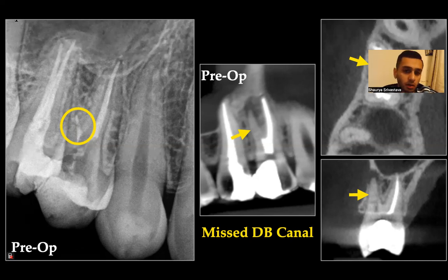First things first, get inside again, remove the existing filling, look for that 3rd canal, obturate, and the patient should be absolutely fine. So the prevalence again, your upper molars and lower molars, they're quite notorious to have extra canals. They can have bifurcations, trifurcations. In this case, we have 3 roots. Very rare to have that in an upper premolar, but it's not that we don't know of them. Okay, and there's no indication here that would tell me that there was a 3rd root in here.